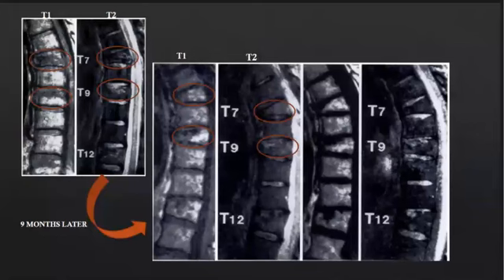In this case, we observe that marrow signal intensity abnormalities that were found in the acute phase of benign compression fractures of vertebral bodies show, after 9 months, iso-intensive signal intensity. This demonstrates almost complete reversion of marrow signal intensity abnormalities to iso-intensity, typical of chronic fractures.